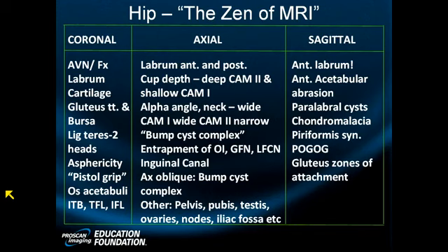Now this time we have a very kooky angle. Angle should have gone this way. It's more orthogonal. Let's see, perhaps they gave us a correct angle. This one maybe is a little better. Not much better. But that is one weird-looking femoral head-neck junction.